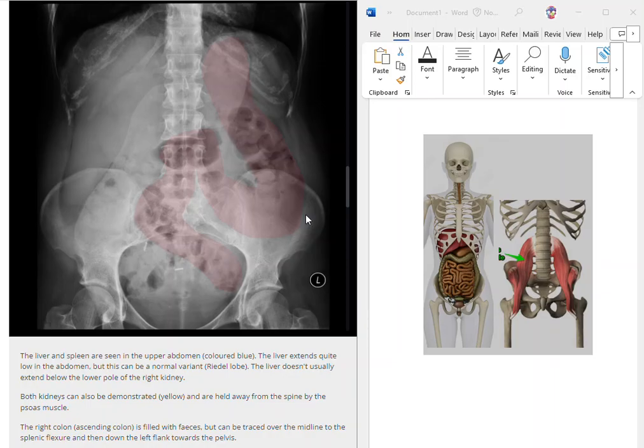rotation of the abdomen. I'm also going to do, I think in the same video, rotation of the thorax and show you elongation and foreshortening of the ribs, to show you some rotational movements so that you can see how it will look on the x-ray and how we'll be able to identify what x-ray we're looking at by looking at the skeletal structures and the elongation and foreshortening and comparing the right and left sides.